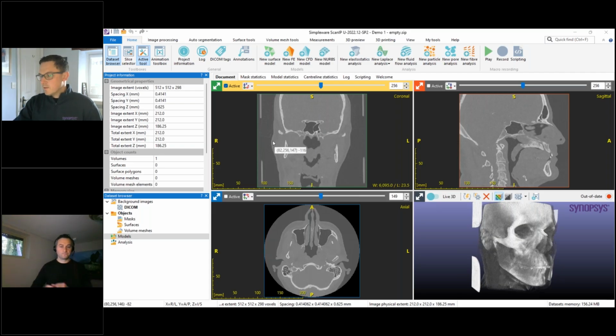Okay, so I guess with these demos with the AI tools, they're probably some of the easiest demos we could do as application engineers, because as you probably saw in the Nicholas George's Hospital one, a lot of the time you just press go and it gives you the results. So you won't see too much interaction with the tools today. It's just showing you where to press go and what it looks like and what you might have to do afterwards, maybe highlighting some of the other features along the way.